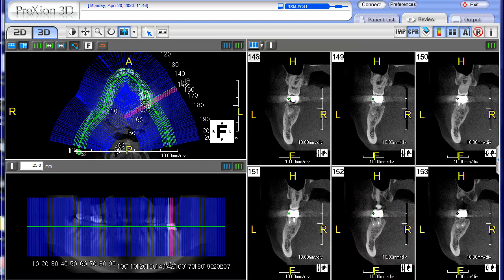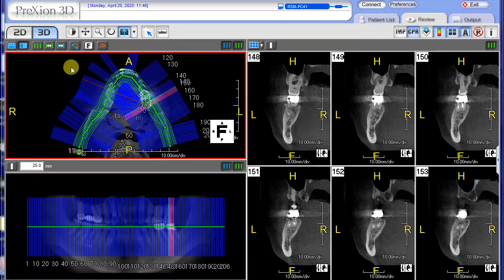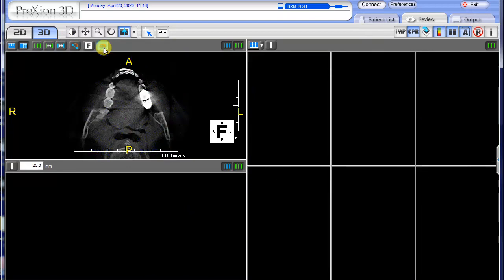Over here you could change the number of CPR lines. I don't mess with those. If you want to smooth the line, you can click this one. If you want to reset your CPR, just hit reset and redo. When complete, hit CPR to exit.